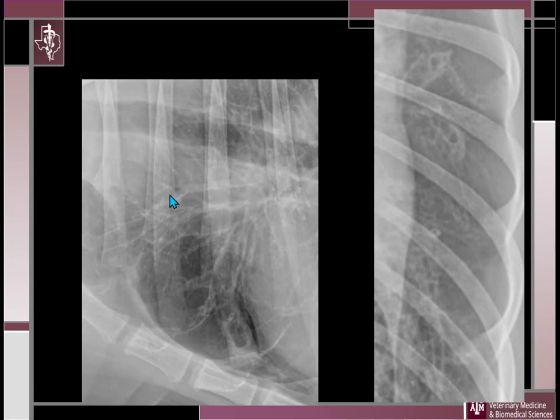I can still see all these linear soft tissue vessels going out into the periphery of the lung. But when I start looking at these lines, it just looks like some parallel white lines. There's a round circle here. There's some thickening right here. There are parallel lines. It looks thick. These little white lines, which are the bronchial walls, are thickened.